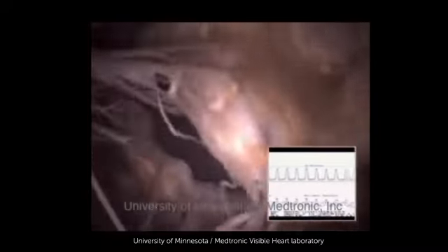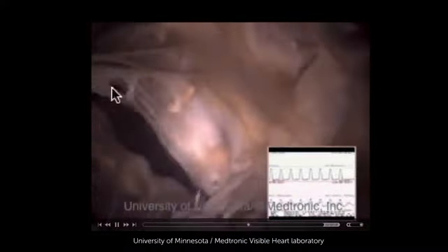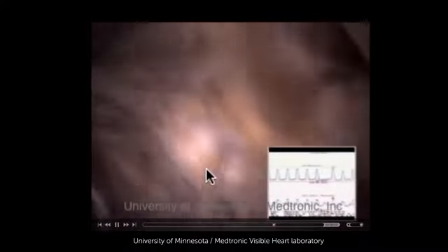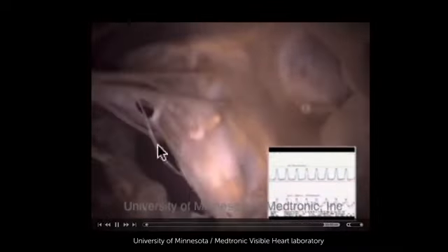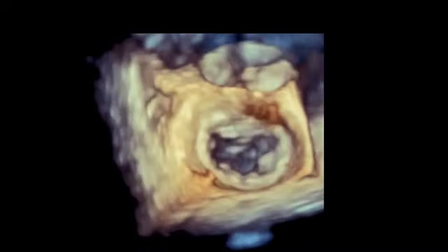This video shows you the mitral valve from the other side, from the ventricular side. This is where the chordal structures attach to the mitral valve. There are a number of different chordal structures which form a fairly complex subvalvular apparatus. Many of these structures can be visualized with echocardiography. Again, here's a three-dimensional reconstruction of the mitral valve. The valve which lends itself probably the best for three-dimensional reconstructions and three-dimensional imaging with echocardiography.